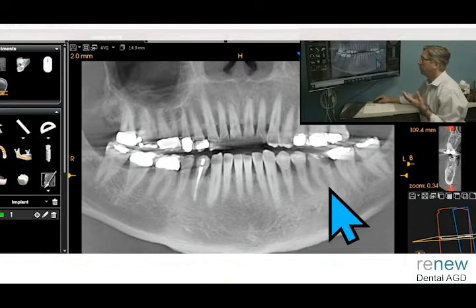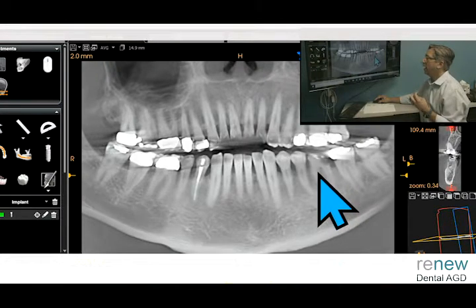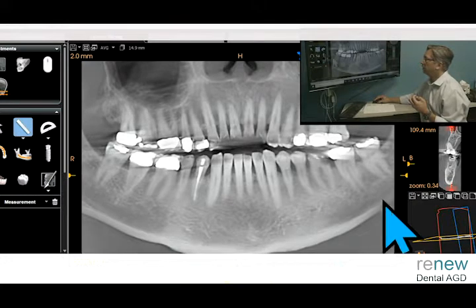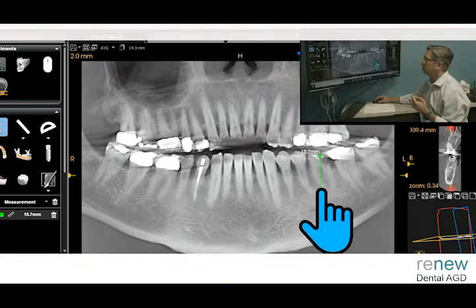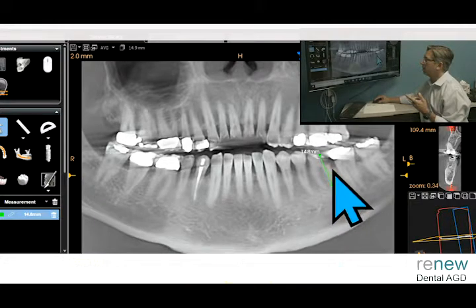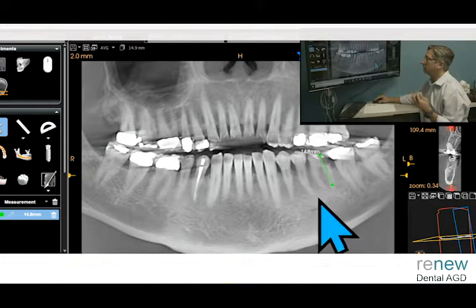So when you clip that bone away, when you go back in to do the surgery, I don't have this bone forcing my drills to find that spot, right? Your drills are going to want to hit there. They're going to deflect off that bone and go at an angle, or they're going to go into this socket. You have to remember that these little socket holes 3.5, 4 months down the road are not going to be as strong as the native bone that's already there.